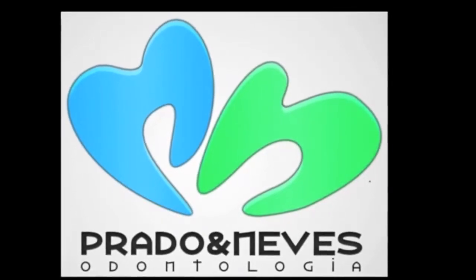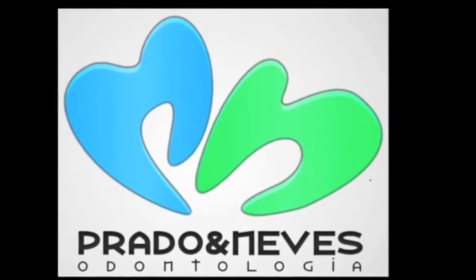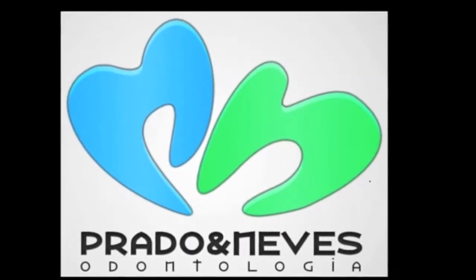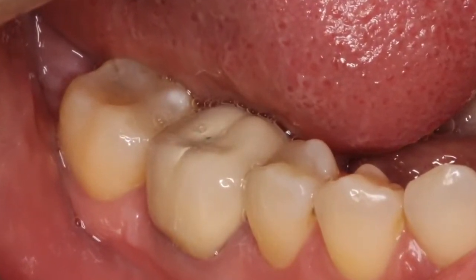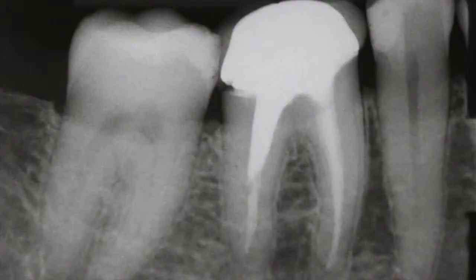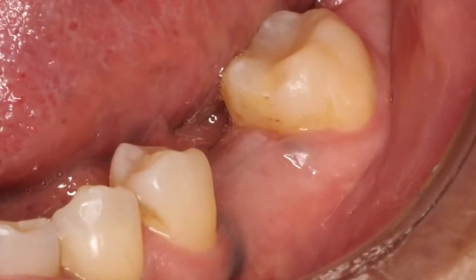In this video, we show the individual biogeneric and biogeneric reference modes. The case that will be presented refers to a patient who had a leak in an unsatisfactory crown of tooth 46 and the missing tooth 36 that already had an osseointegrated implant.